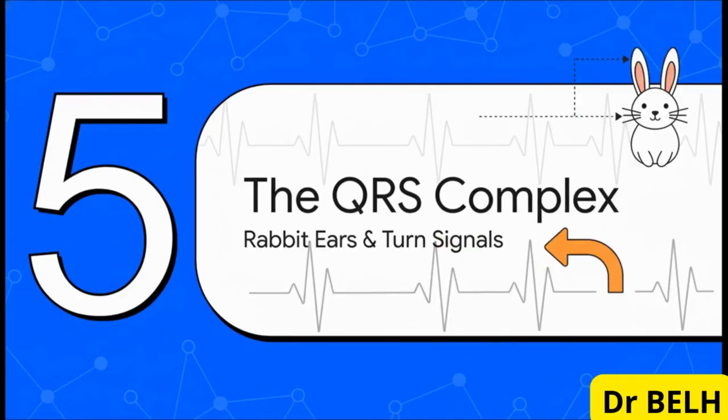Now for the main event on the ECG, the QRS complex. This represents the big squeeze of the ventricles. We're looking to see if the QRS is too wide, over 120 milliseconds, because that tells us there's a delay, like a traffic jam in the heart's wiring. This is a bundle branch block, and we've got some great ways to spot it.